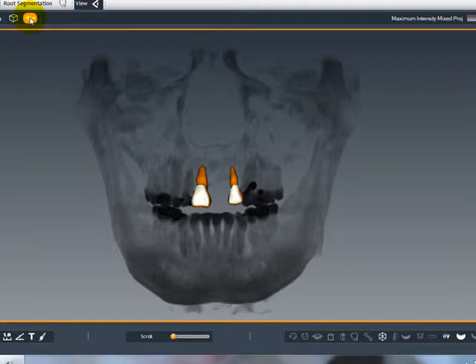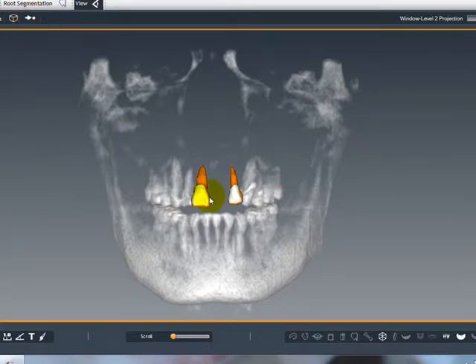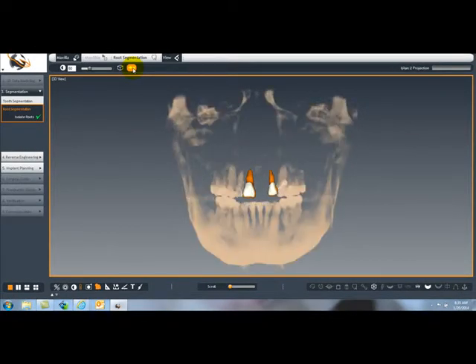And now we can technically take that view, move forward, and mirror image number 8 and position it into the number 9 position with the teeth and the roots as well, and then position the implant to be in the optimum position in terms of the load vector based on the bite. So I will proceed to the reverse engineering process.